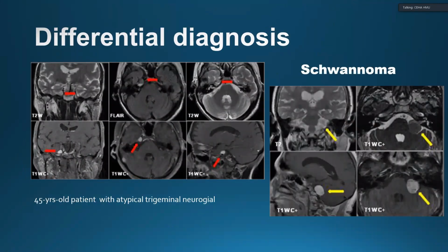And you know that on the 3D machine in our department, we can do the fusion between the TOF and the CISS. We can fuse the TOF and the CISS on one sequence, so it is easier to detect the conflict between the nerve and the vascular structure. Okay, have you ever done that before, Nga? Do the fusion between the TOF and the CISS?